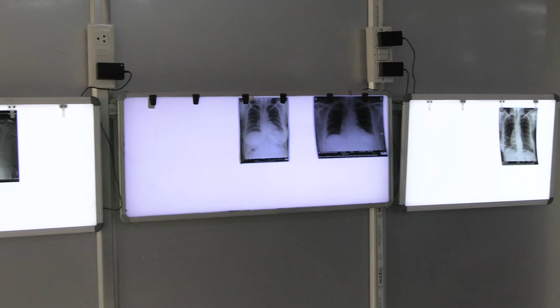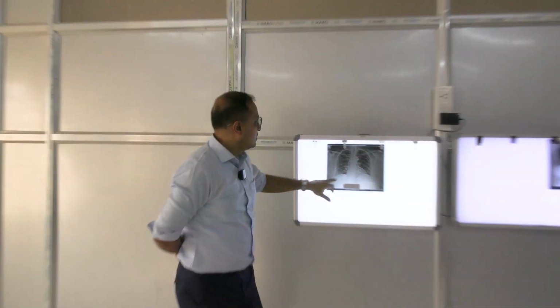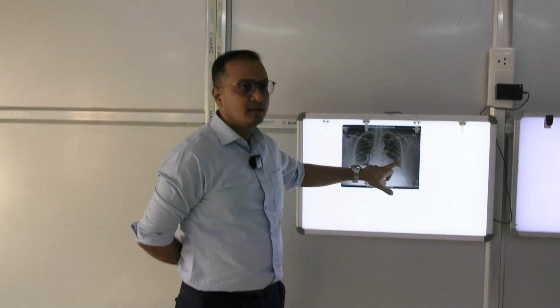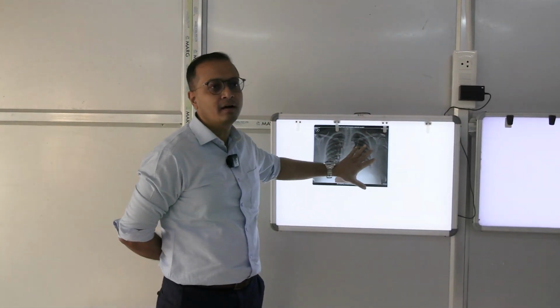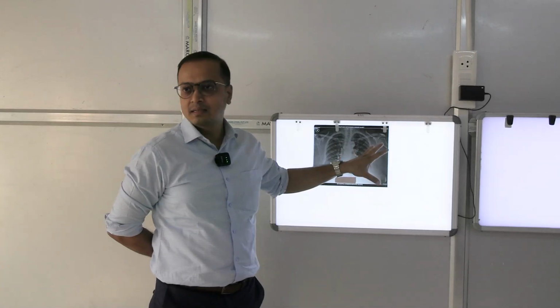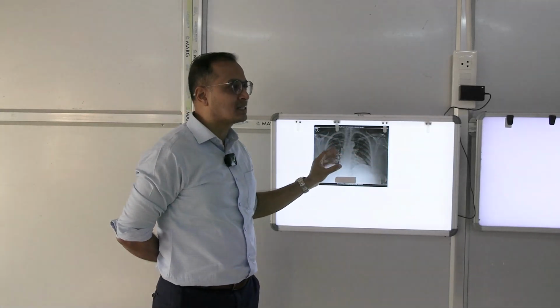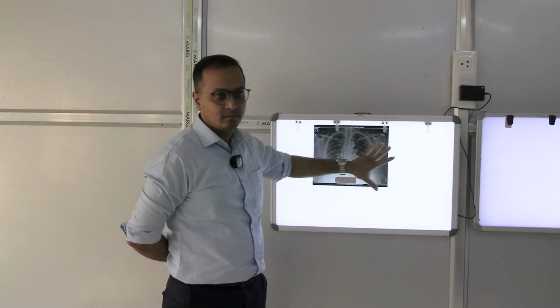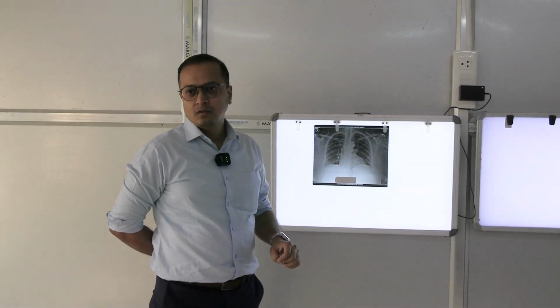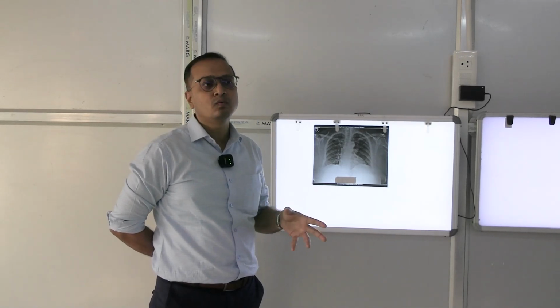So these are the things you have seen, identifying the right border, left border, knuckle, etc. Within this particular lung shadow you see some kind of whiteness. That whiteness is not localized; it is scattered and sparse, as if something is there. This we call bronchovascular markings.